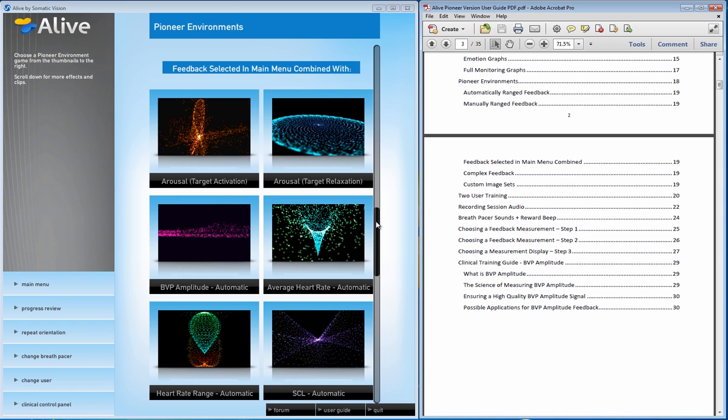And you can also train with dual drive, with two people at the same time. And what that looks like is the cooperative mode, where one person makes the car go and the other person makes the fog disappear, so that together you work to win in dual drive to clear the fog and speed up your car.